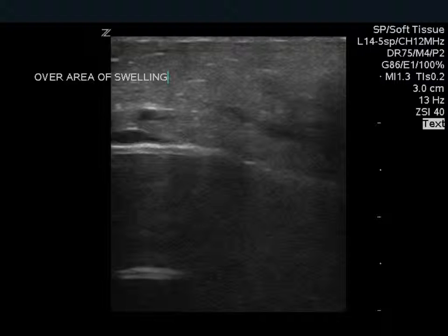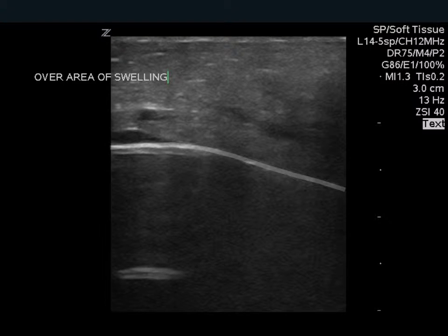Case in point, this image was taken from a 4-year-old girl who had a dental infection of a right lower tooth. This image was taken with a linear probe over the body of the mandible, with the marker pointing to the right, or posteriorly in this case. This is roughly the line following the bony cortex. As in the previous example, it's not as bright as we might expect because it isn't always perpendicular to the ultrasound beams that are coming down. Now, the tissue superficial, or above the bone, is homogeneous, but it's pretty tough to tell anything more from this image.